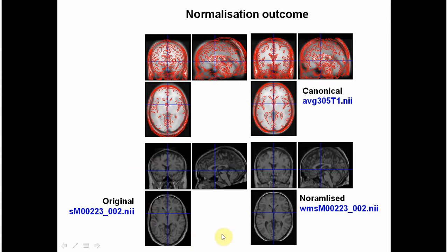On the left bottom, you see the original structural image and the projection of its contours on the template, and on the right, just what we have seen a few moments before.